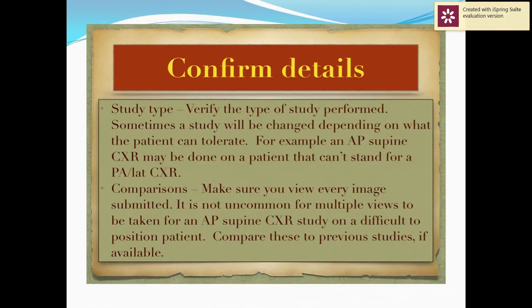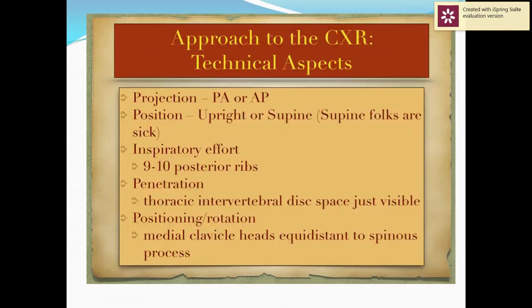Study type also ممكن يكون AP view, PA view. Comparison also the patient's position is very important. Projection very important, that it is PA view or AP view.